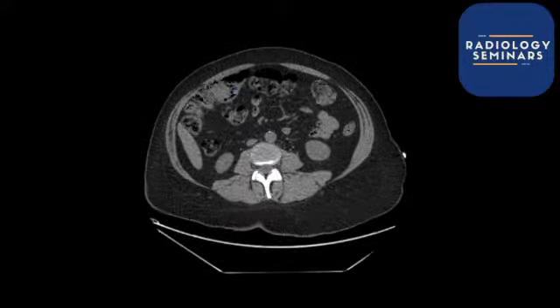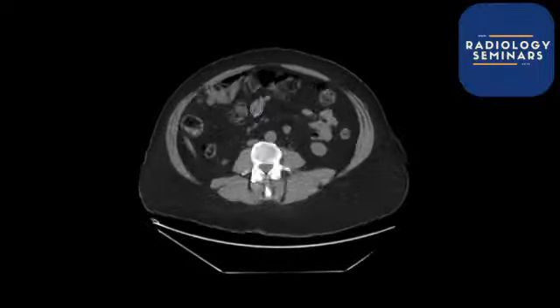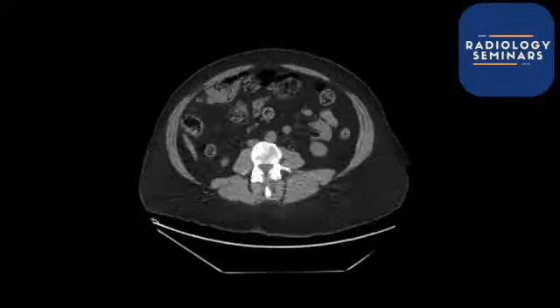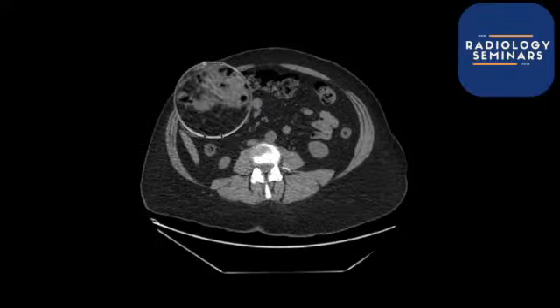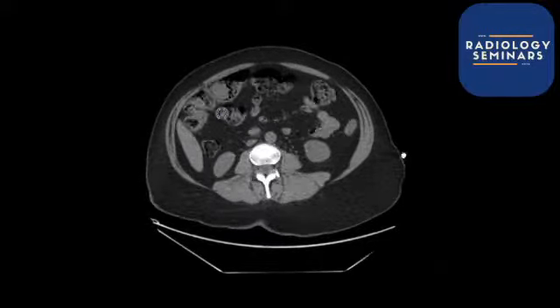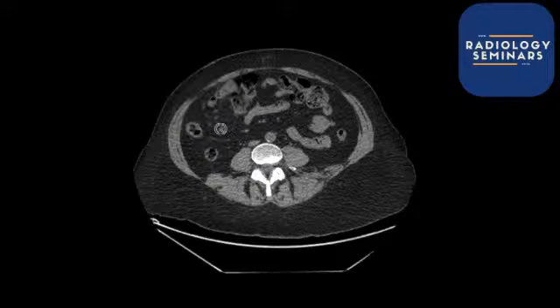So cecal pole, how do I know that's a cecal pole? Let's try and find the ileocecal valve, which is going to be around here. The ileocecal valve, we've got this fat lip-like structure, and you can see that the terminal ileum is coming out of there. Can you see that? I'm going to just follow that. That's the terminal ileum over there.